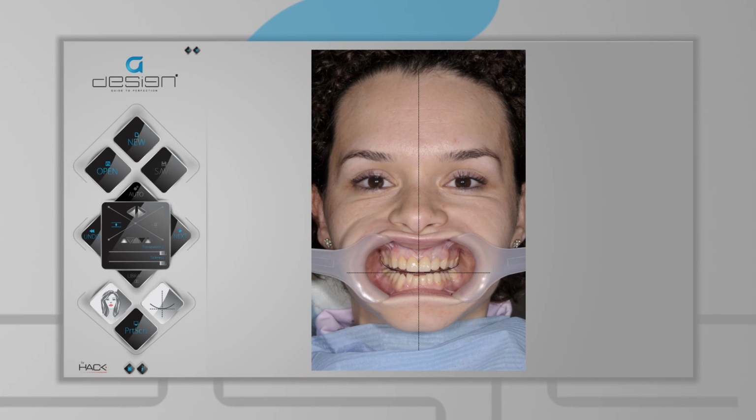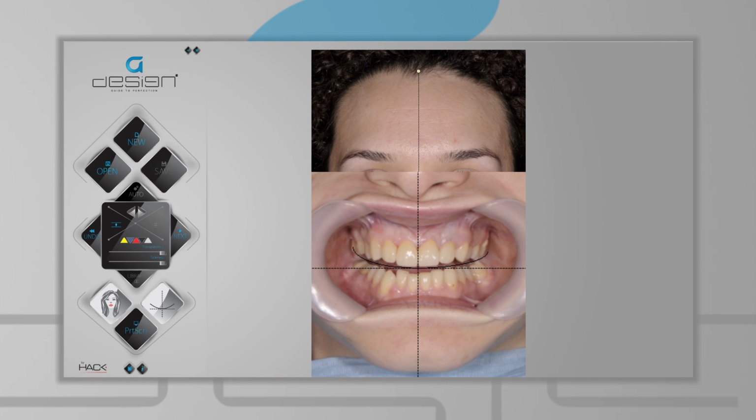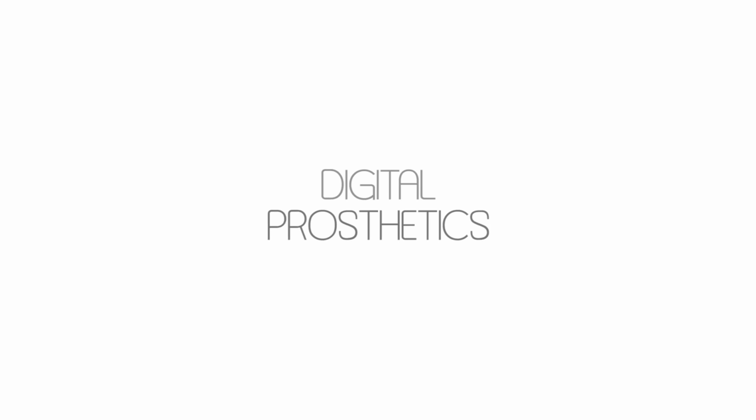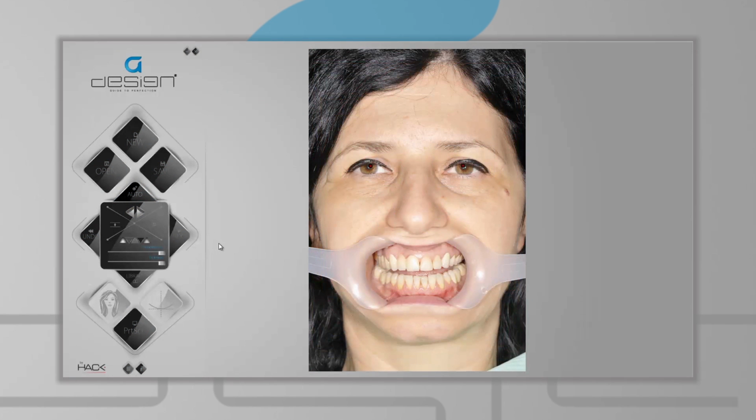Checkup. The application can also help check the results and their accuracy. Digital prosthetics, in lab, guiding the zirconia frame. The symmetrical features of the face automatically detected by the application are the eyes or the pupils in more than 80% of the cases. After detecting them, the software calculates the facial information required for the aesthetical design of the front teeth, the facial axes, and the incisal edge.